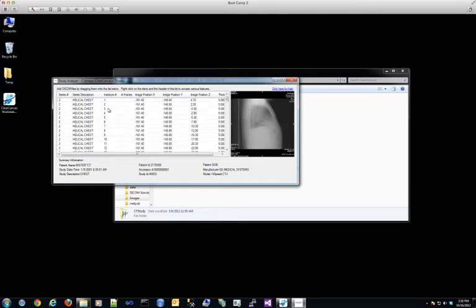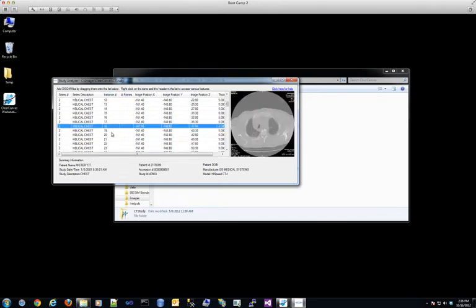Now, removing them that way does not actually delete them from disk. It just removes them from the application, in terms of the files it knows about or you're working with at this given time. Furthermore, I may actually look at these images and realize that I don't really care about the first 20 images, so I'm going to delete them.